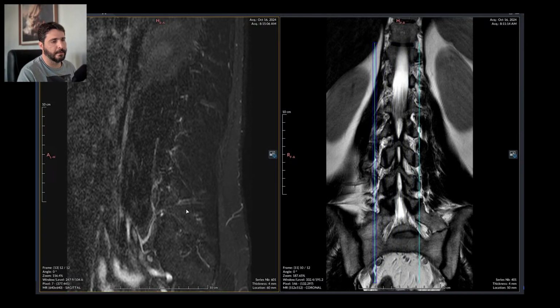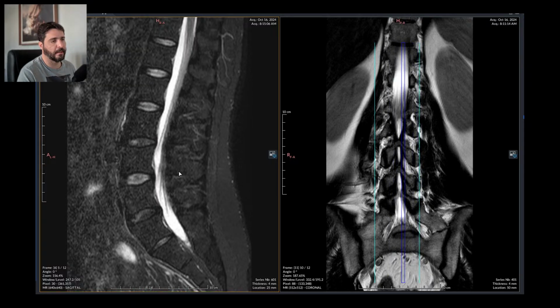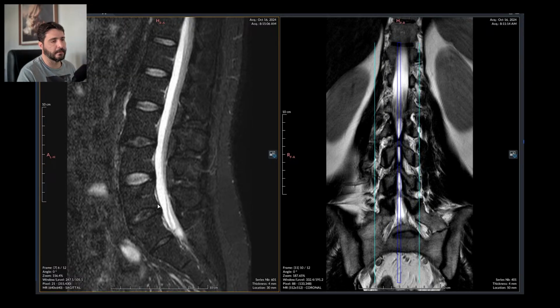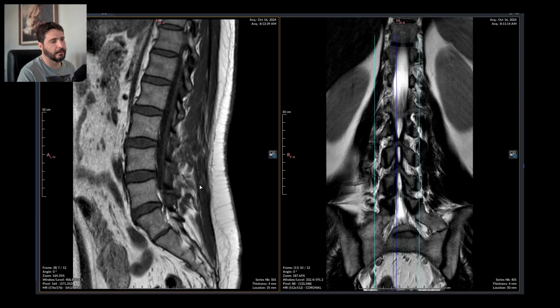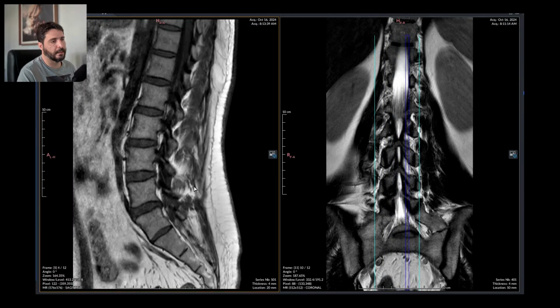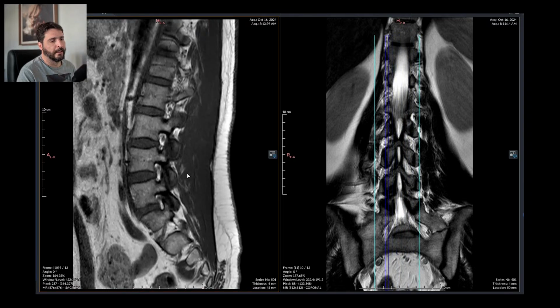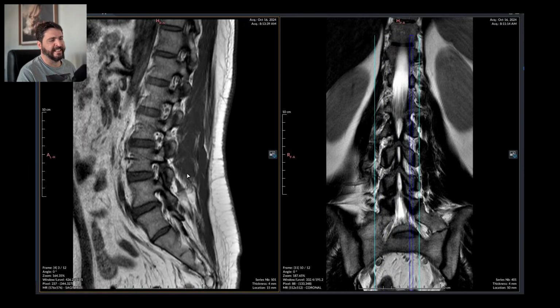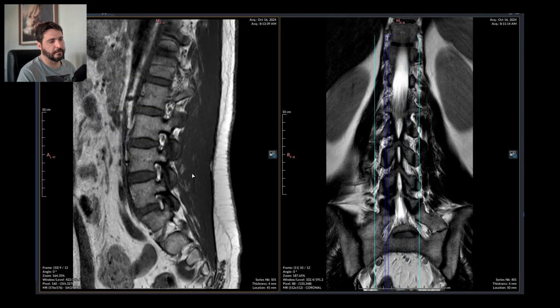And I can see here that the entire exam was done with the same marking, so it was entirely done wrong. There is a tiny spot of bone edema right there. Let's grab a T1. A tiny bone edema. Probably a ligament inflammation, an anterior longitudinal ligament inflammation.